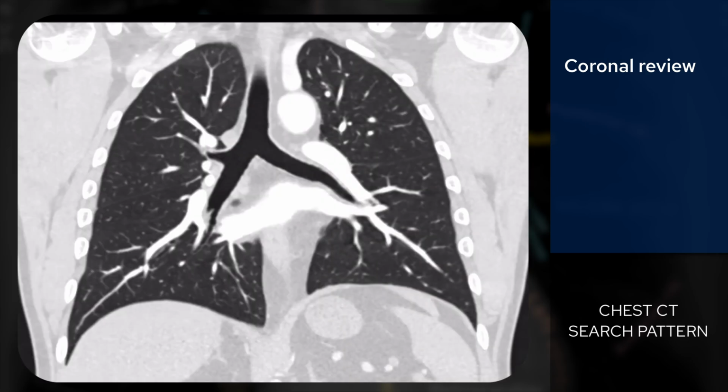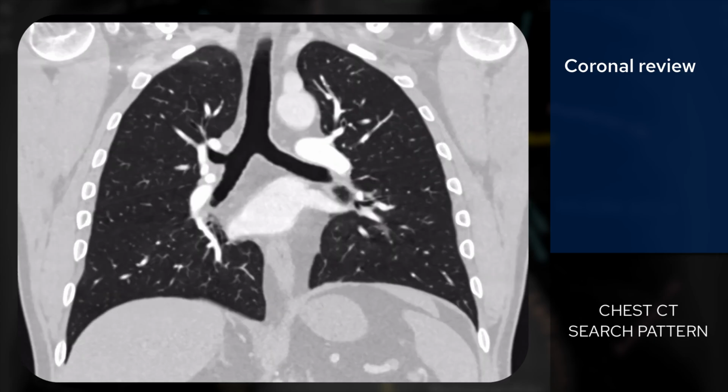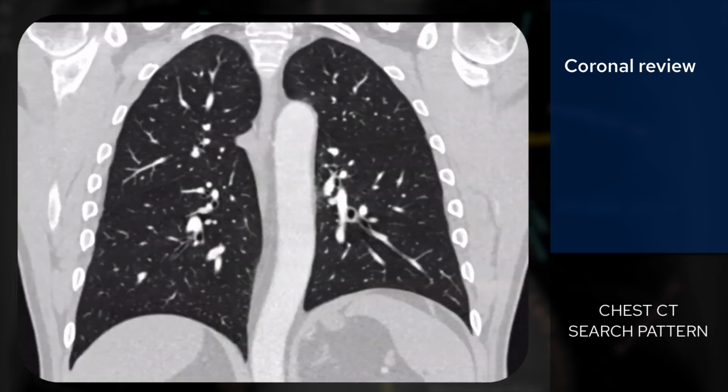And I'll go back onto the lung windows just to give myself another perspective and to see if there's anything else that I've missed. And that's my usual review for looking at a chest CT. And if I've done all of that, I can be fairly certain that there's probably not a lot that I would have missed when looking at a chest CT.